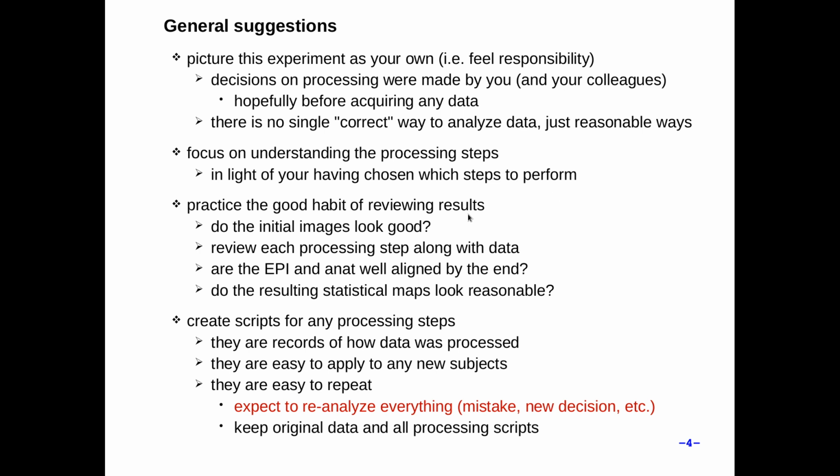And as always, you want to practice the good habit of reviewing results. Do the initial images look good? For at least some of the subjects, you want to review each processing step along with the data in detail, which is basically what we're going to do in this set of videos. Are the anatomy and EPI well aligned at the end?